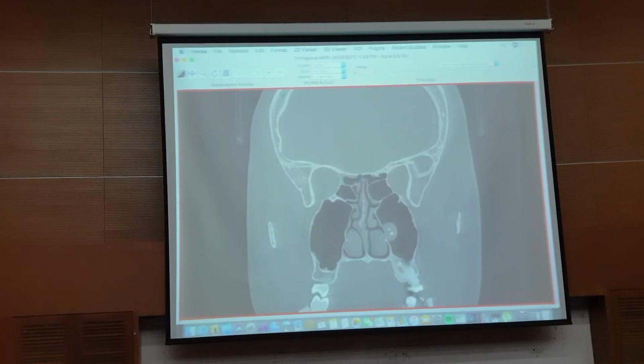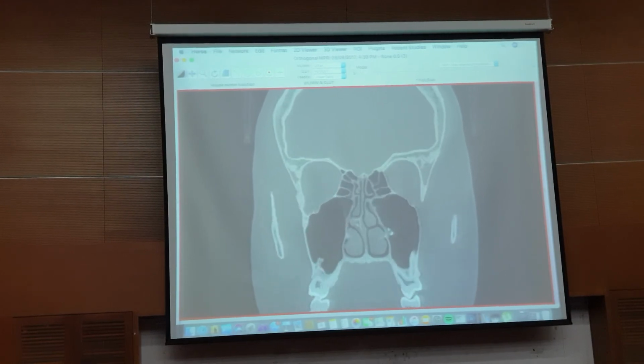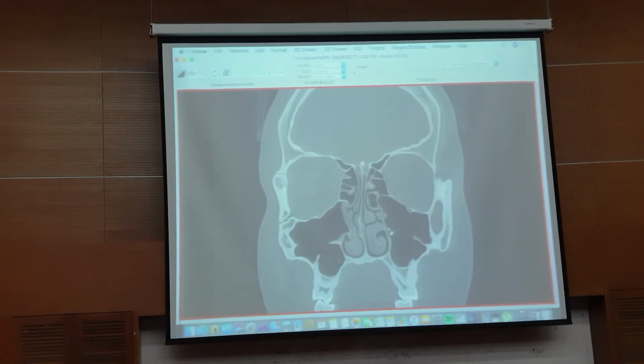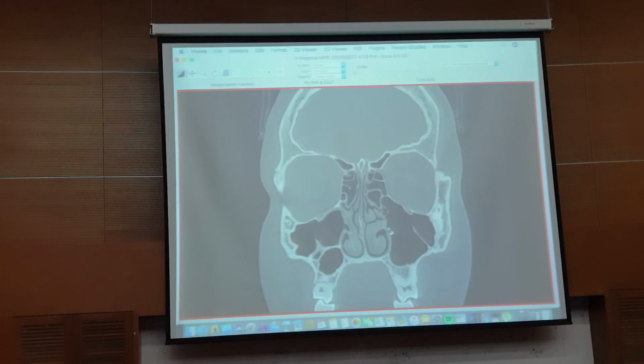Actually, there was something you probably should have seen round about here. Yes, excellent. You can see the anterior ethmoidal artery here, and it's not at the skull base, it's anomalous. It's a little bit lower. Maybe some supraorbital cells here. So this one also could potentially be a problem.